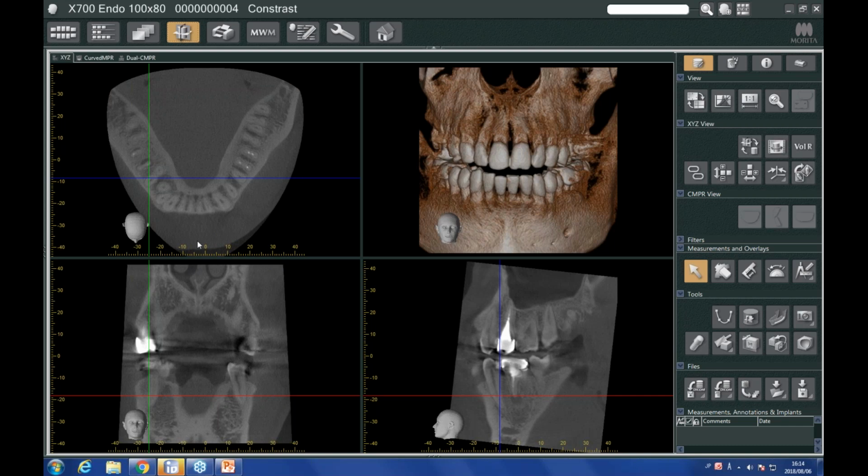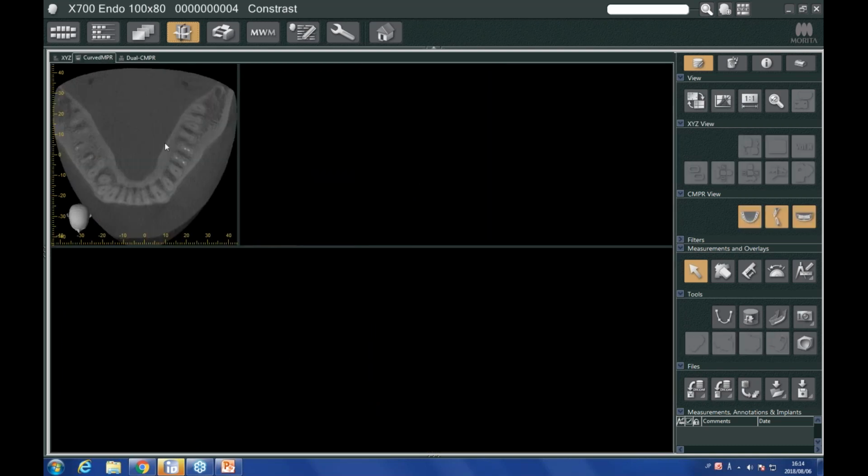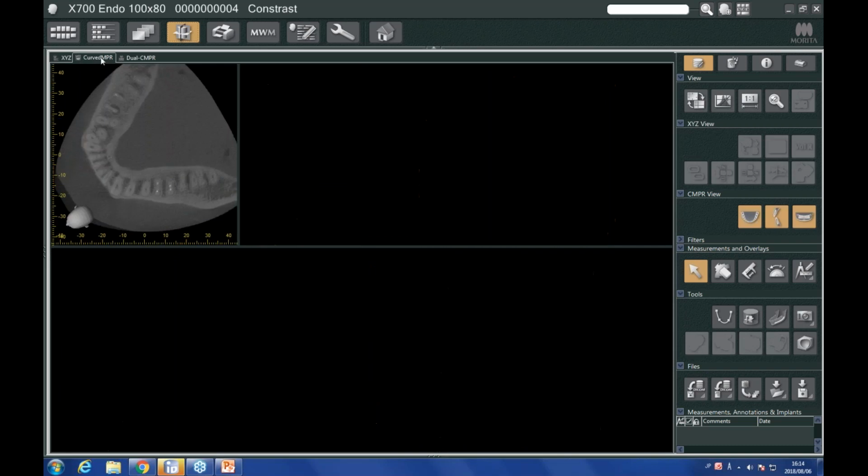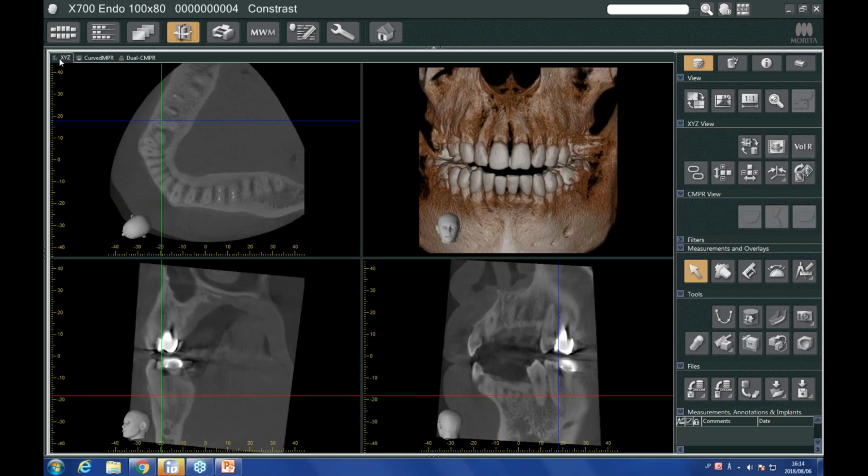This is very typical of analysis that you receive from a radiologist. So if I click on this tool or this tab here, what you're going to see is whatever image I have in this window is going to show up here. Just to make it very obvious, if I rotate it like this, it will again be rotated here as well.